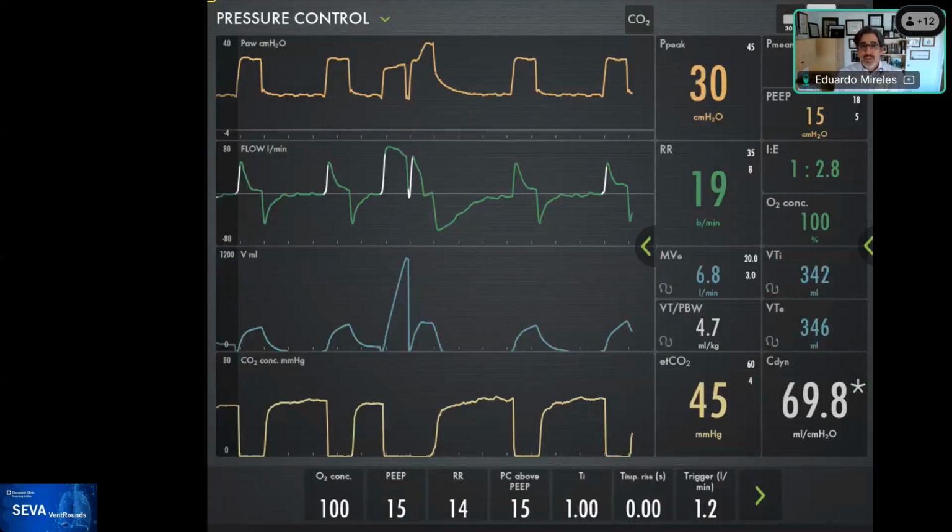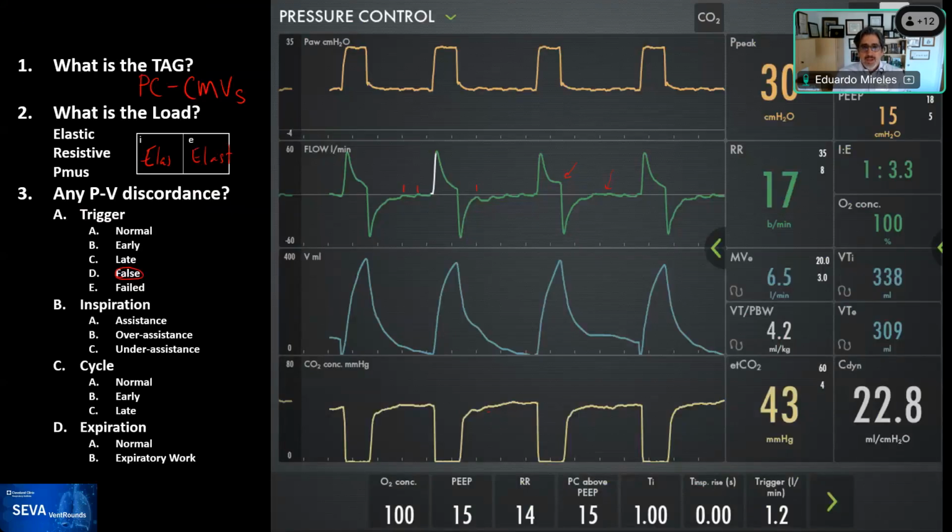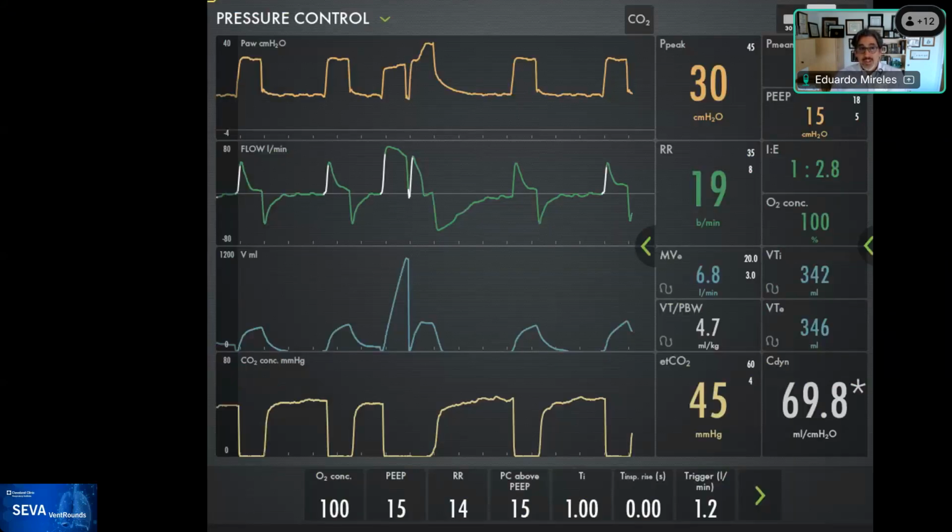So I just wanted to show this patient had been an issue overnight with multiple problems with the ventilator and with asynchrony and double stacking, double triggering. And so this is the graph that I chose for you to see because it has that subtle PMOS and the false triggering. But then you can see this is actually what I saw when I was walking by. And you can see the breath, a breath, and then this one over here, correct?